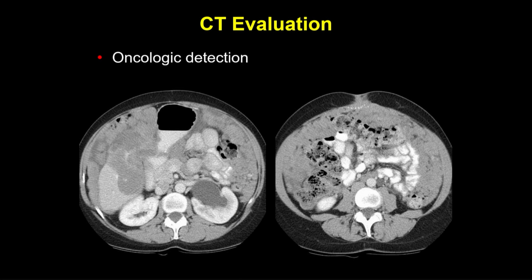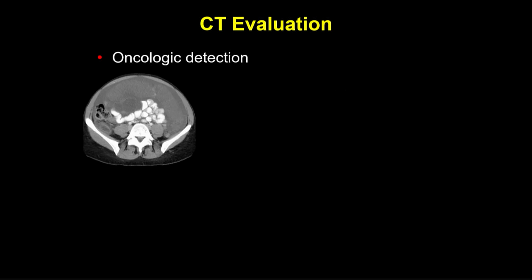And then any tumor that gains access to the peritoneal cavity, of course, can cause either carcinomatosis or, as I said, lymphomatosis, et cetera. This is an adenoid cystic tumor, a minor salivary gland tumor, I think of the parotid or something, but a very slow-growing tumor, but you can get carcinomatosis from anything as long as it gains access.